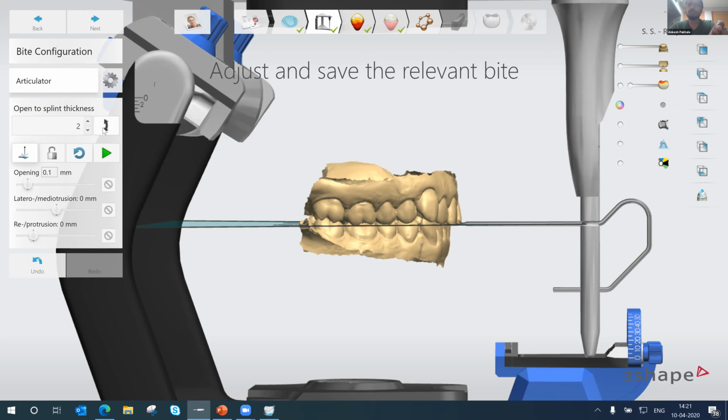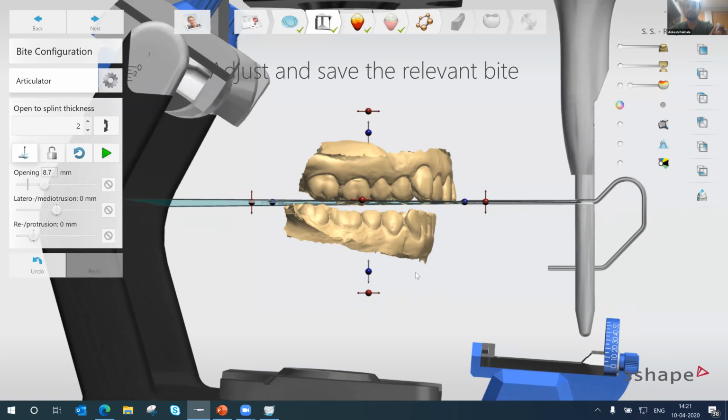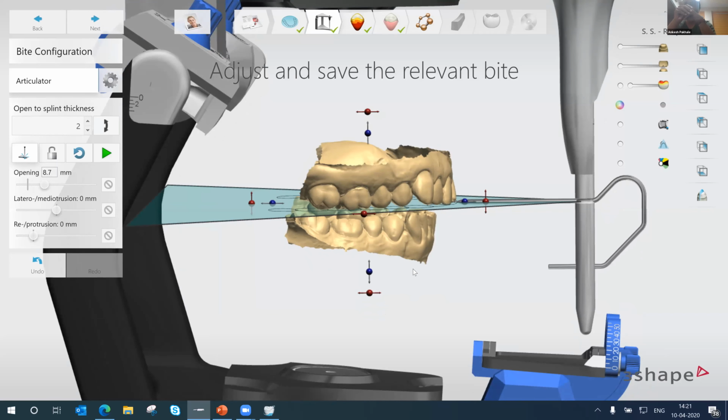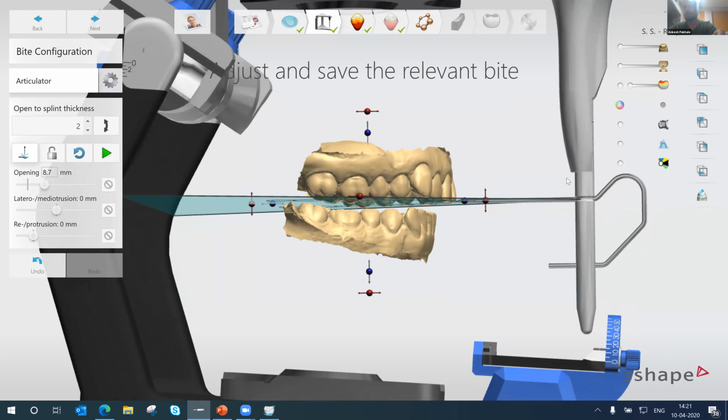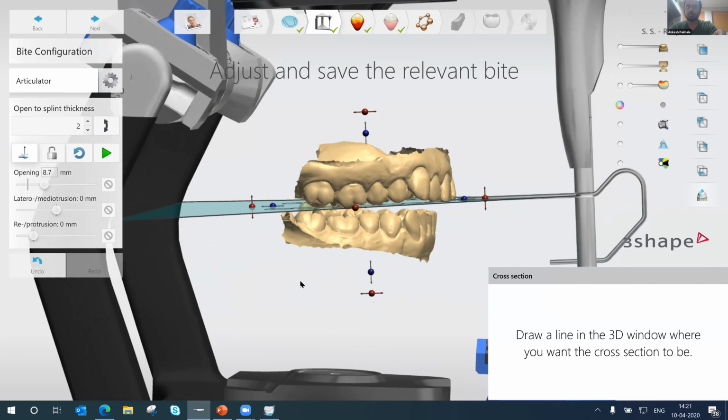Let's take a look over here. All right, so all I'm going to do here is raise, and here the system has raised it. So wherever you consider the minimum thickness, it will be at least 2 mm or more. If I take a small 2D cross section over here and measure it, how does it show?